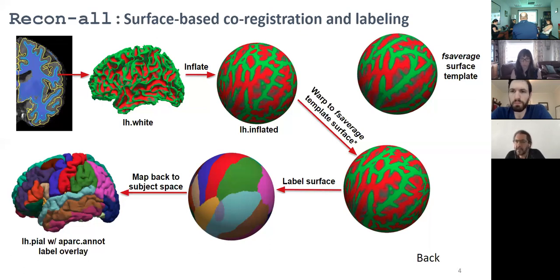And in practical terms, I'm also curious, what do you specify to have FreeSurfer use this particular FS average template? You have to specify a file that contains, in FS average space, your desired parcellation, and then another file that tells you, in the target space, what curvature profile you would expect on an average subject. What information does FreeSurfer need for this, if you want to change the type of space that you want to analyze the data in?